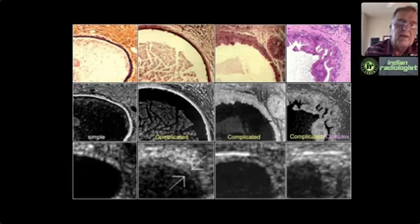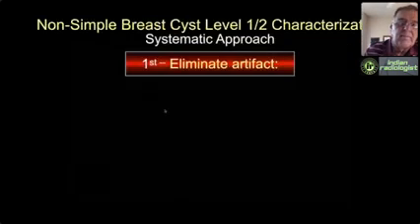So what this is showing is that we have a simple cyst on the left, complicated cyst in the middle, and because there's echogenic fluid, we could call the right cyst complicated, but because it has irregular thickening of the wall, it could also be considered complex cystic and solid. Now, anytime we have a mixture of reassuring and less reassuring findings on ultrasound, we classify by the more suspicious findings, so the right one would have to be considered complex cystic and solid rather than complicated.